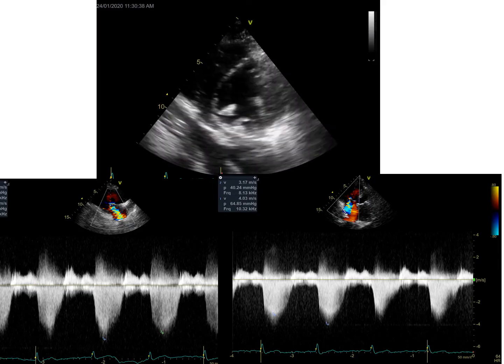This is one of our examples of a patient who clearly has septal flattening and is suspected to have pulmonary hypertension. In this signal, on the left-hand side, you can see that there is an angulation problem such that the path of blood flow is different than that of the Doppler signal, leading to underestimation of the right ventricular systolic pressure. On the bottom right-hand corner, you will notice that the maximum velocity can be estimated, but the example here is that of over-exaggeration due to lack of consideration of the modal velocity.